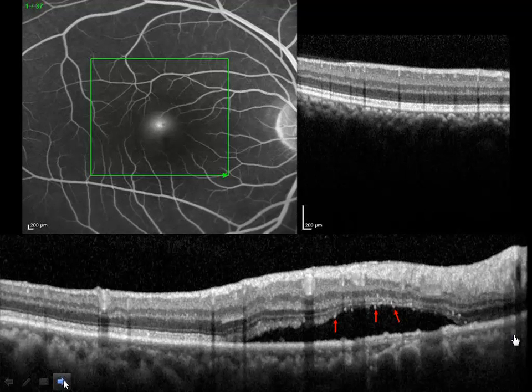Central serous, by definition, is a detachment of the pigment epithelium, PED, and then a larger detachment of the overlying neurosensory retina. Typically, remember the photoreceptors are over here. Now the photoreceptors are separated from the retinal pigment epithelium. In a normal state, the retinal pigment epithelium phagocytizes the debris created, the discs, which are shed by the outer segments of the photoreceptors. But since there's a distance now between the retinal pigment epithelium and the neurosensory retina, they accumulate. And they're sort of like edema residues or retinal precipitates, if you will.